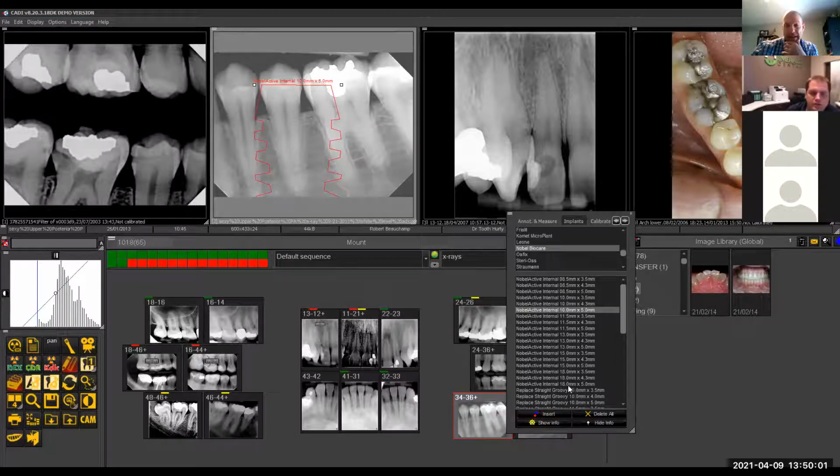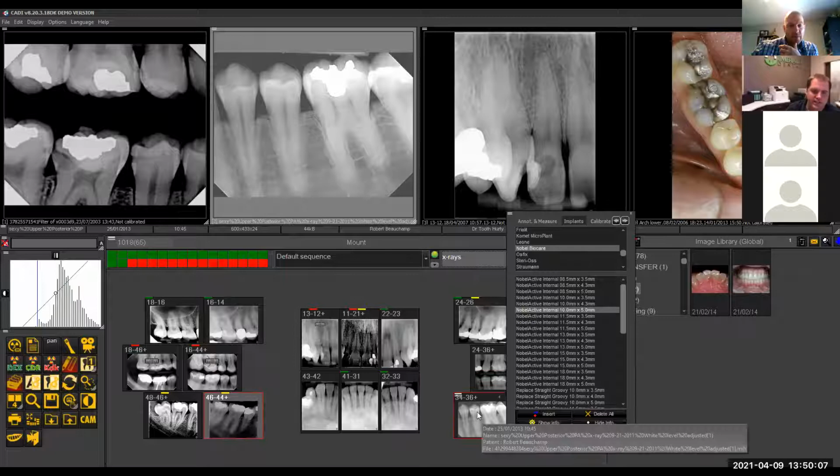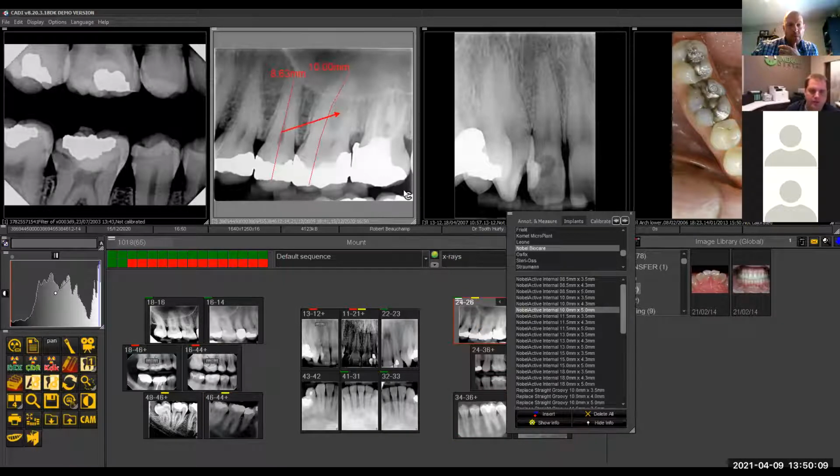Yeah, you see, that's not calibrated. That's the problem. It's just bigger than it needs to be, but you could just resize that and drag it wherever you felt like. You see, there you go. That's a little bit better. So I would pick a smaller one. Obviously you pick something like this. So I would remove this one, delete it, pick a smaller one, since that's obviously too big, and then insert that.